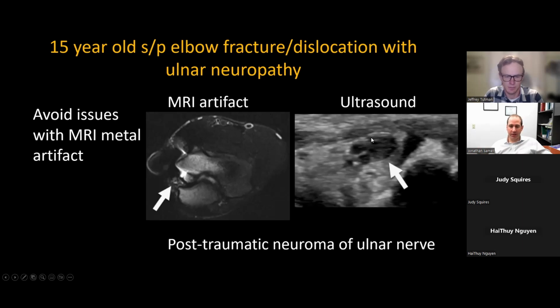and we'll have a little bit more on nerves later on in the talk, but you should have a nice honeycomb appearance with similar appearing sized fascicles. This one you can clearly see is very enlarged, and has ended up being a post-traumatic neuroma, which is kind of like a scar ball of the nerve. And so that focused ultrasound image of the area really added value over the MR. So often they're complementary. So this is a really nice case to show the use of ultrasound.